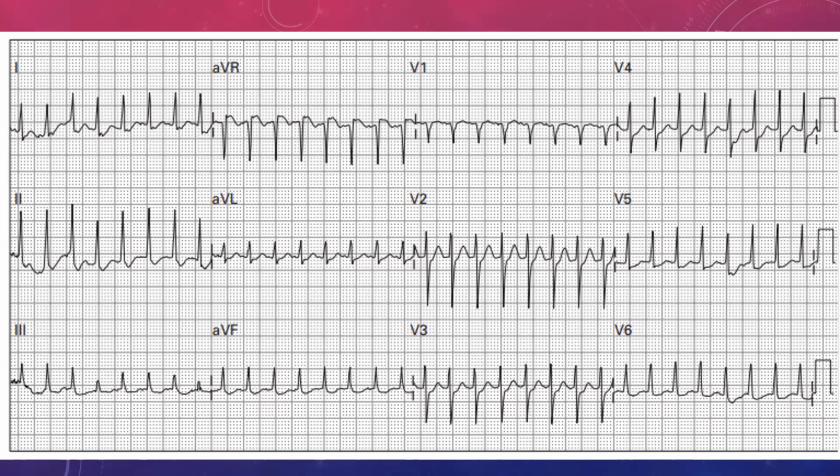Now, in this ECG talk specifically, what I'm going to concentrate on is looking at the tachycardia to try and figure out what it is, and compare it to last week's that we had. What I want to do is quickly go through the fundamentals of looking at a rhythm strip, or looking at the rhythm to determine what it is. We know that this is a tachycardia.